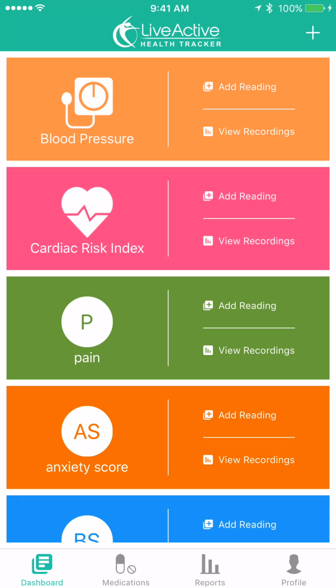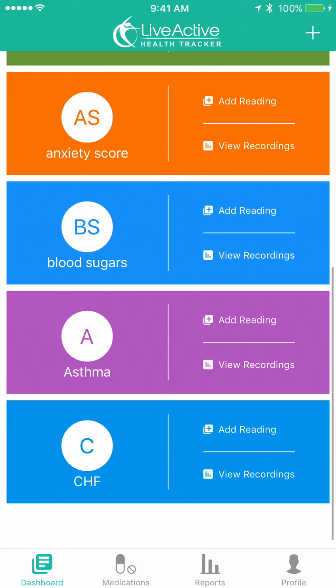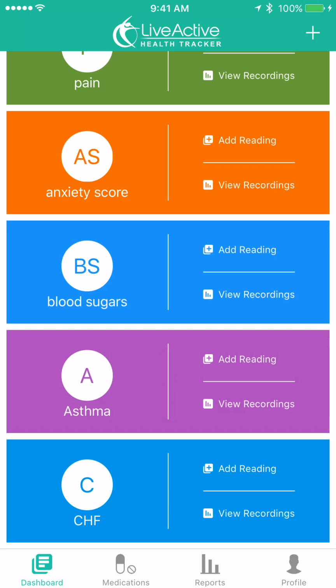Welcome to the instruction video of using LiveActive Health Tracker with CHF management. Here on the dashboard I have created multiple widgets with health issues, and I've added CHF here in the blue.